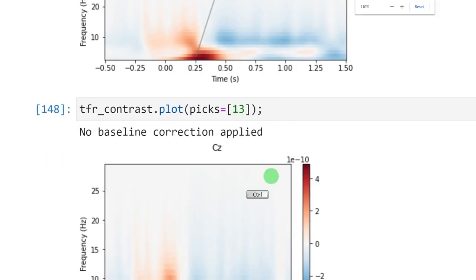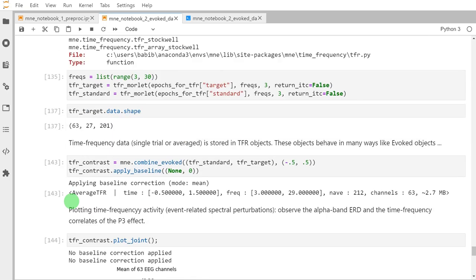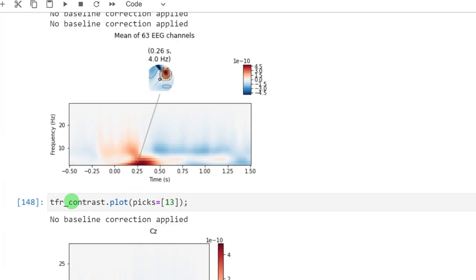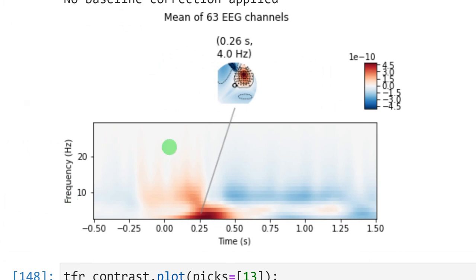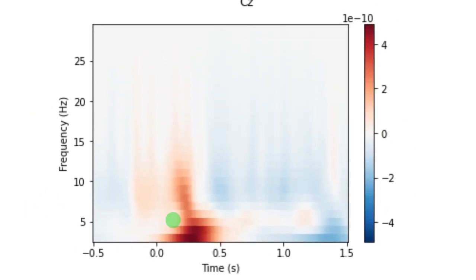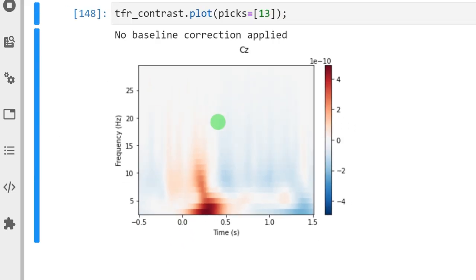Time frequency analysis is an integral part of any EEG or MEG research. Using these tools, we decompose EEG into a time frequency representation or power spectral representation. What we are looking for is to find differences related to experimental conditions and the underlying mental state. In the case of BCI, these kinds of features can be constructed for improved classification.